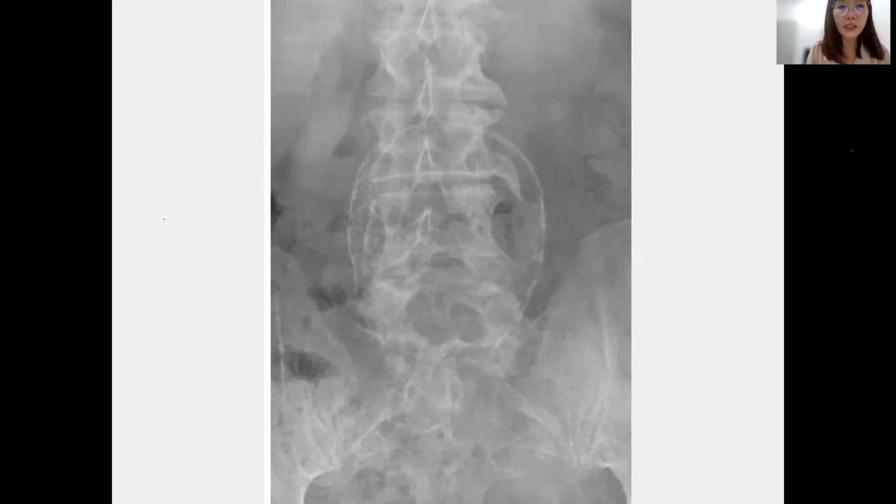But when you look at the X-ray, we cannot give an exact diagnosis. Always refer for ultrasound. You need to refer for ultrasound anyway, to differentiate whether it's actually a fibroid or a stone. If we are not sure, we will have additional imaging for the patient. If we can detect the calcification, that is good enough for our level.